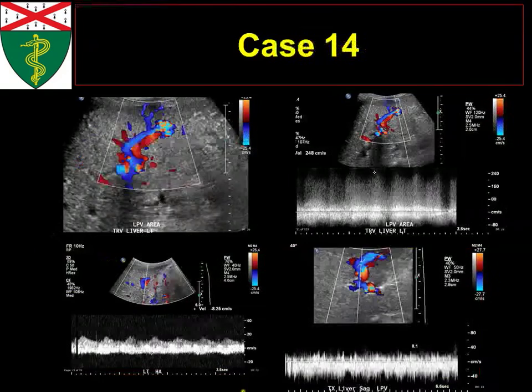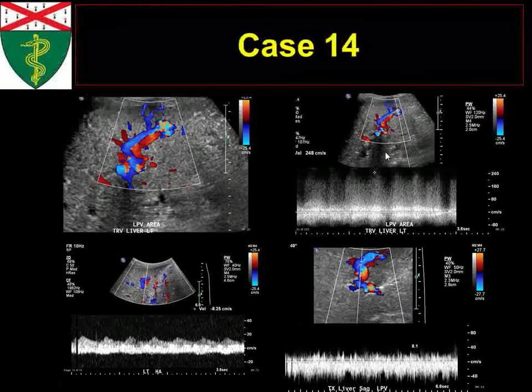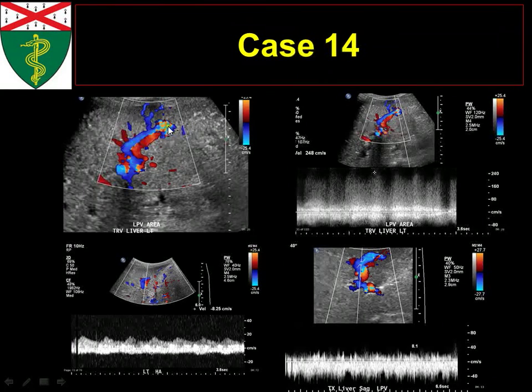And so the idea over here is that when you look at these vessels, there's this arteriovenous fistula. There's 3 components to it. You have the fistula itself, which is the connection between the artery and the vein. And as Marcus said, that has really turbulent flow because you have all this really high flow from the artery going into this fistula and draining by the vein. So that area is really high flow, with all these areas of turbulent flow over here. Sometimes you can get a soft tissue bruit because the parenchyma around that area vibrates because there's so much flow going through it. It's much like an arteriovenous fistula in the arm. If you ever feel those, you can actually feel the vibrations from that fistula. So here you see the turbulent flow.